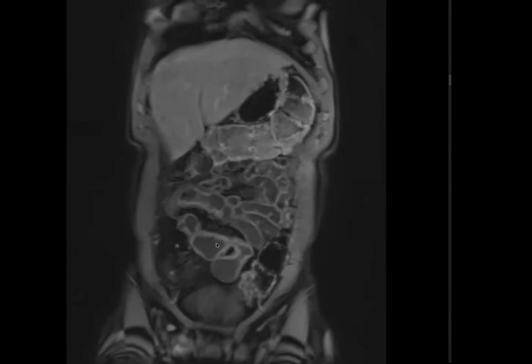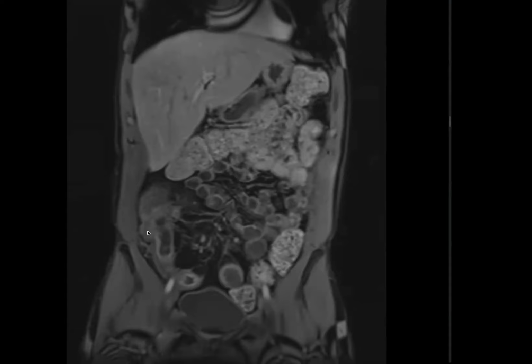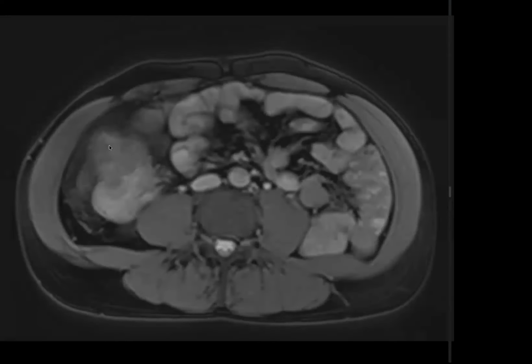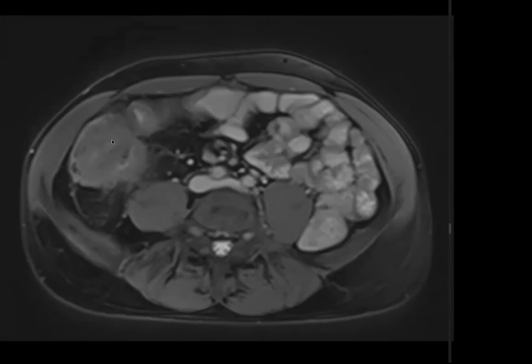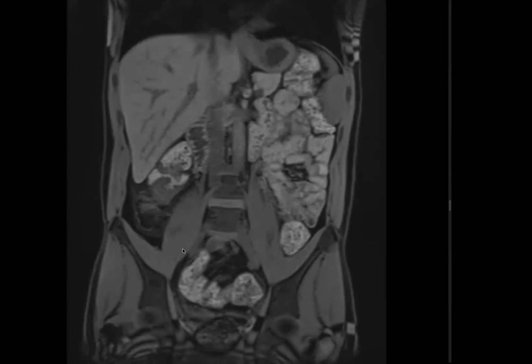For instance, you spent time talking about possible stricture versus peristalsis. That's well done. They'll appreciate that. But in this particular patient, he actually had an enterocolic fistula. So when you see bowel loops right next to each other with loss of fat plane in between, even if you can't demonstrate actual luminal continuation, you have to flag it. And I think it's actually slightly better seen on the contrast images.